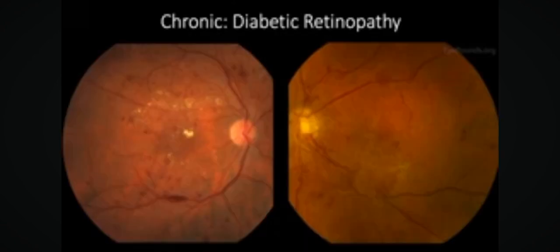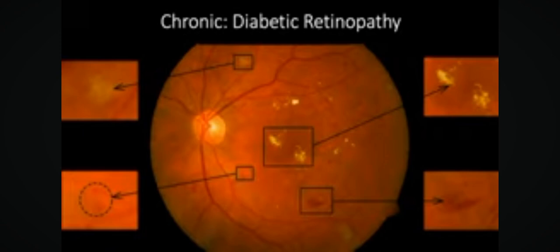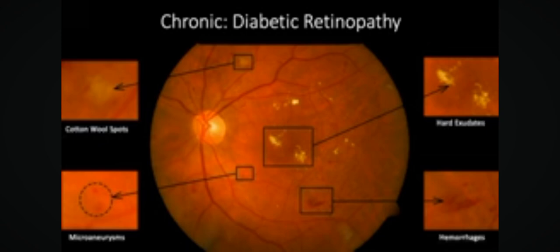The next condition we will review is diabetic retinopathy. Diabetic retinopathy is the leading cause of vision loss worldwide among patients aged 25 to 74. Diabetic retinopathy is often classified into two categories: non-proliferative diabetic retinopathy and proliferative diabetic retinopathy. The distinguishing feature between these two categories is the presence of abnormal blood vessels as seen in the highlighted box. This process of neovascularization is characterized by a lacy network of blood vessels as indicated by the flickering white outline. The classic signs of non-proliferative diabetic retinopathy include cotton wool spots, microaneurysms, hard exudates, hemorrhages, and retinal swelling.